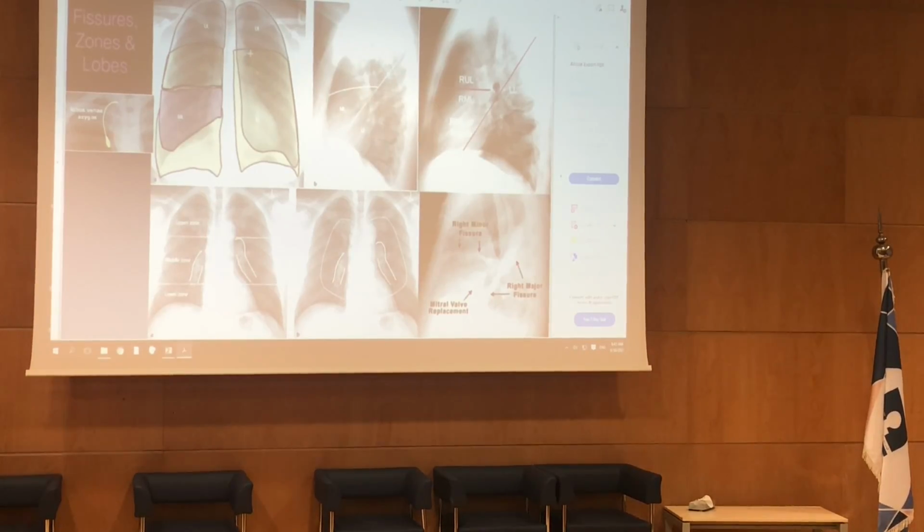But for you to know how the lung is actually divided on the frontal radiograph, you have the two upper lobes, which are similar to one another, and then you have the left lower lobe, and in comparison on the right, you have the additional upper lobe, then the middle lobe, and just a small lower lobe on the right, okay?